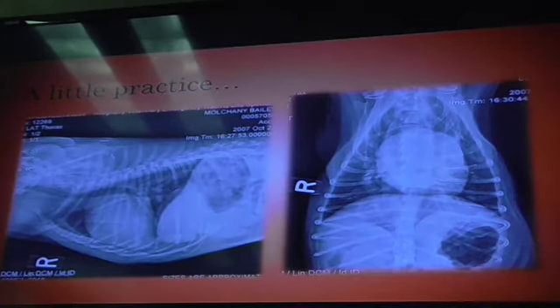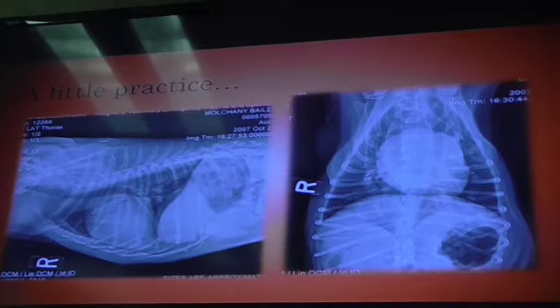So this goes with your question. All right? How do I know that that's the artery? That's why when Kim first saw it on the ventral dorsal, I asked her to point it out on the lateral. That's going to be one of those things because subjectively, that vessel looks enlarged. Okay? We're going to support that by seeing if we can see it on the orthogonal view.